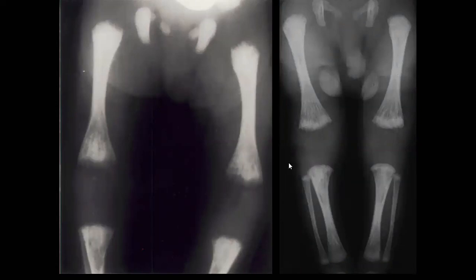When you see something in kids, you will mention many things, okay? Go to your approach, okay? And no, it's not rickets, but maybe it will be considered in the differential. One of the good differentials, yes, congenital rubella, which has a typical appearance, celery stalk, yes, this is what's called celery stalk.